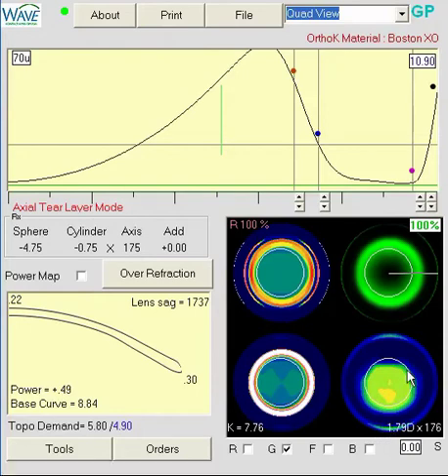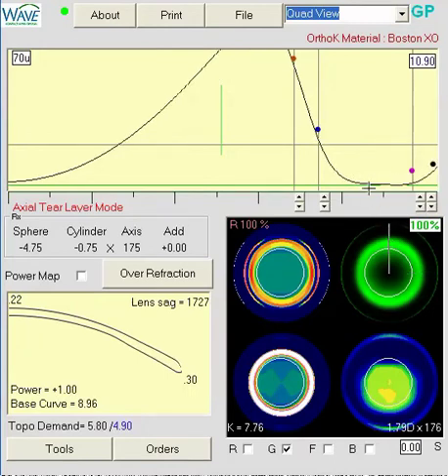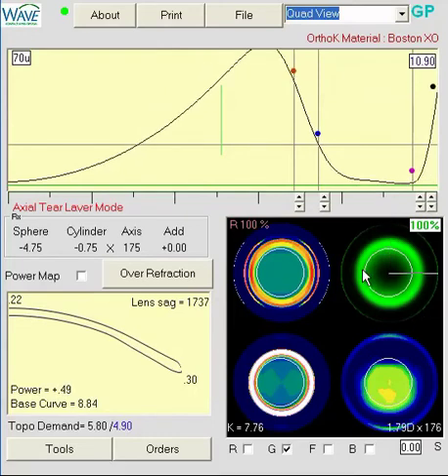Looking at the topography itself, I also see there's a little bit of flattening superiorly and inferiorly, and I think that might be artifact. It does affect how our lens looks in the periphery. It looks like wave aligns it well vertically, and then horizontally there's a little bit of funny stuff going on. I wonder if that is artifact, and I'm not too familiar with the Medmont topographer. If there is an option to edit out unwanted dots, perhaps that would just smooth that out a little bit.